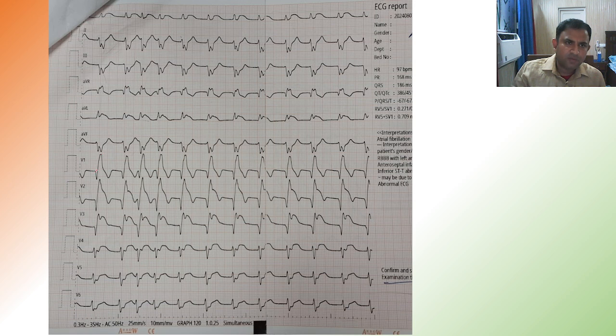Where do you look for the P waves? For P waves, you look at lead 2 and lead V1. Can you see any P waves over here? Can you see any P waves? There is complete absence of P waves over here.